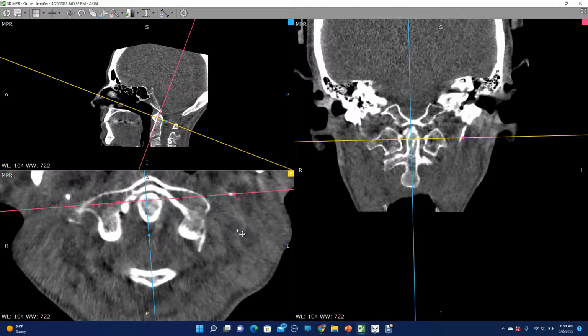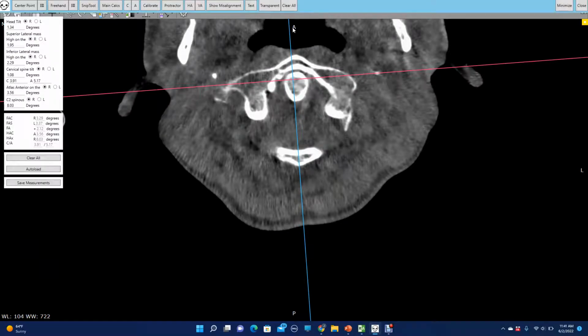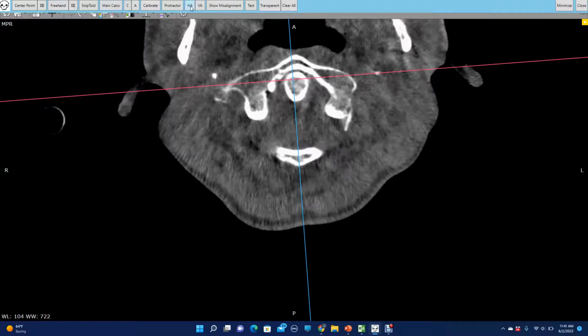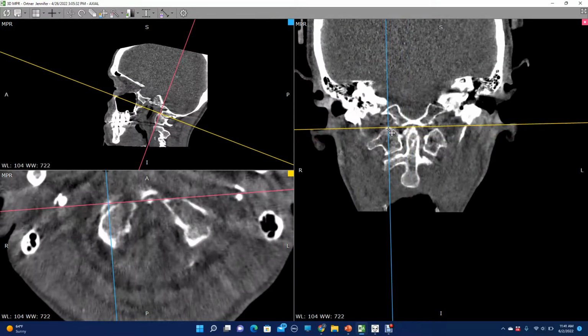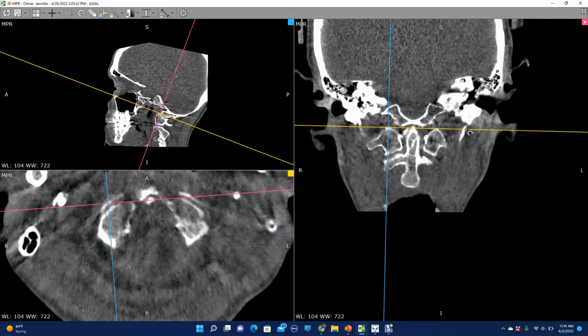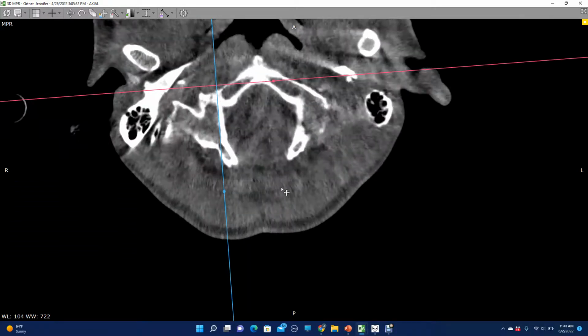And this is my issue now, is that if we were to measure this rotation along the tilt of the skull, atlas is here, and atlas is there. Okay? That's right where atlas is. However, if we were to more look at the atlas rotation along that superior plane line, now, where is that atlas?